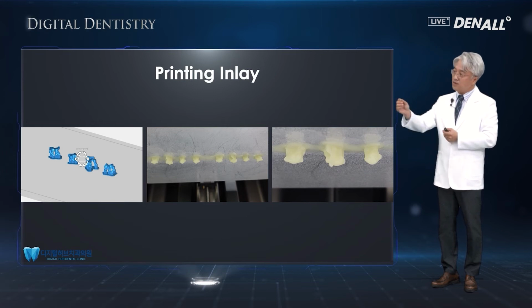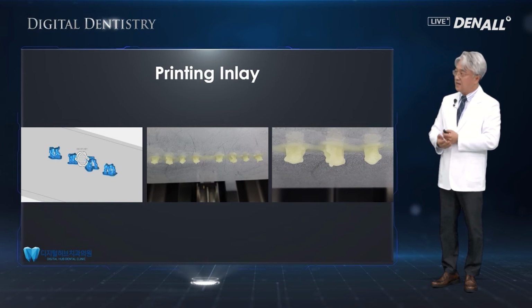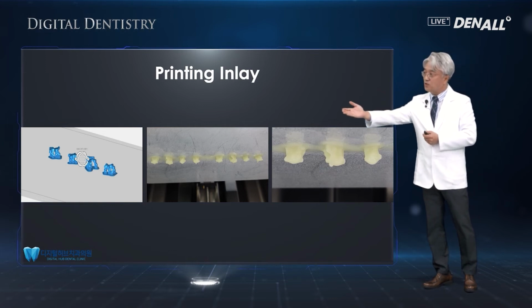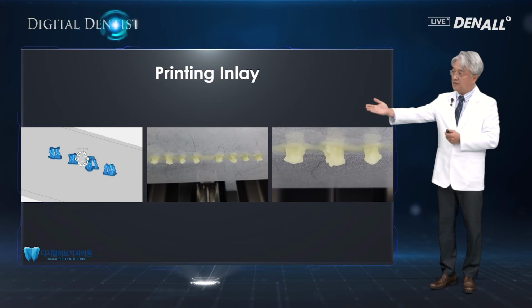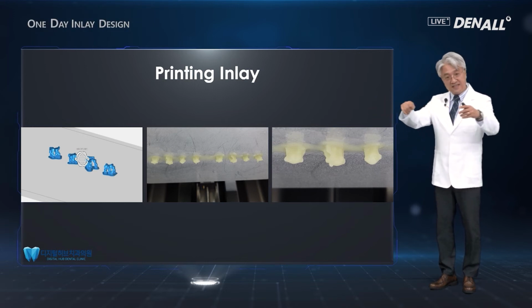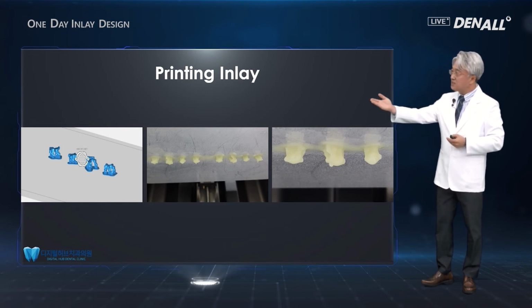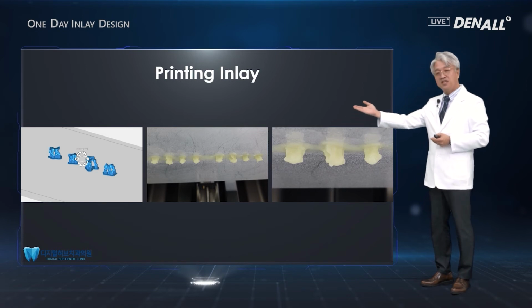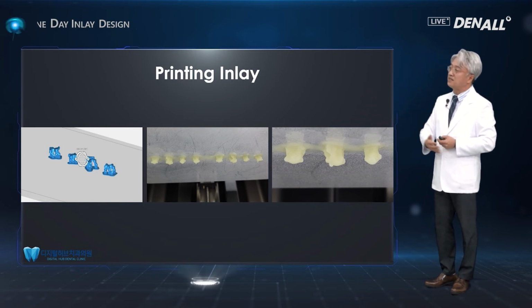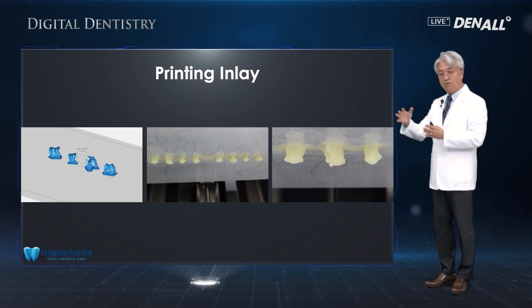So, you also need to use supports, and how to use that support and all those shapes are explained in the far left image. So you put that in the 3D plate, then print, then the next two pictures are just right after printing. So if you see the enlarged image, the two shapes are quite good.